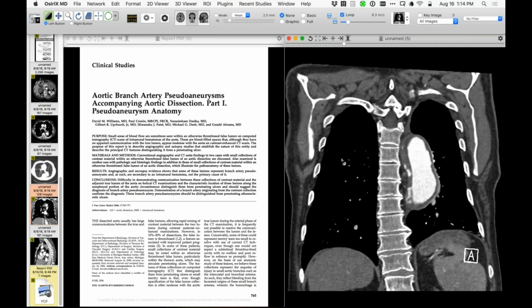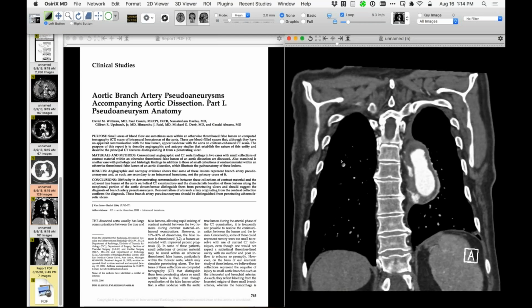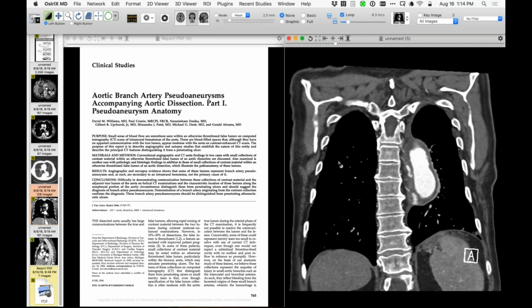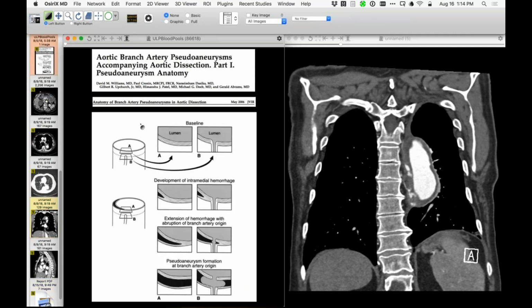So yeah. Signs aren't very helpful if you don't know what the sign is named for. So this is a new one for me. I'll just go with pseudoaneurysms, but I think that's a way cool case. Yeah. David, I just posted a link to a bunch of pictures in the chat section of GoToMeeting. But you're right. Yeah, signs are only useful if you know what they're talking about in real life. Yeah, so this is a lovely case of that.